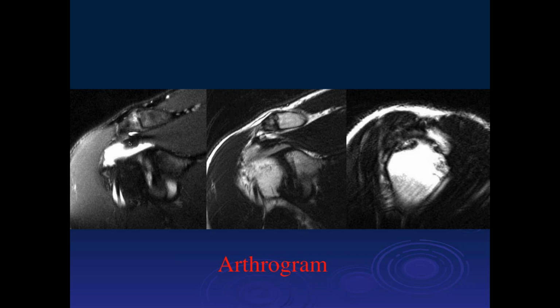It probably means that it's chronic, and the patient is able to scar, and he probably has enough stability with the scarring that we really don't see here, that we're not getting a whole lot of retraction, and he still has good muscle development. So there's probably enough scar stability from the scar that his supraspinatus is still somewhat functional here.